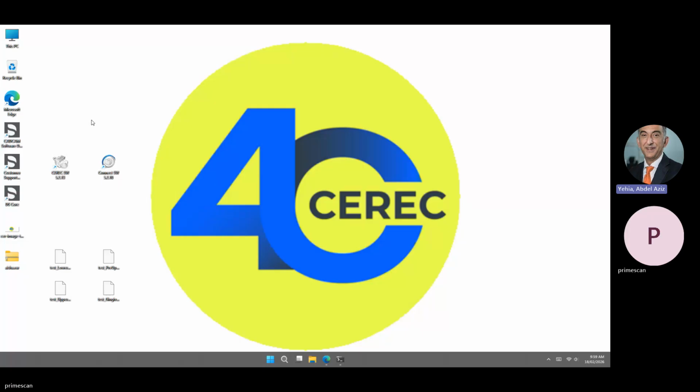module. And in this module, I am sharing the screen now of the PrimeScan unit. It doesn't matter whether it is a cart or a laptop version. In the cart version, which is the one I am using, there are two softwares. One is the Connect software and one is the CEREC software. Okay, this is typical in the cart systems. In the laptop, we only have one, which is the Connect software.